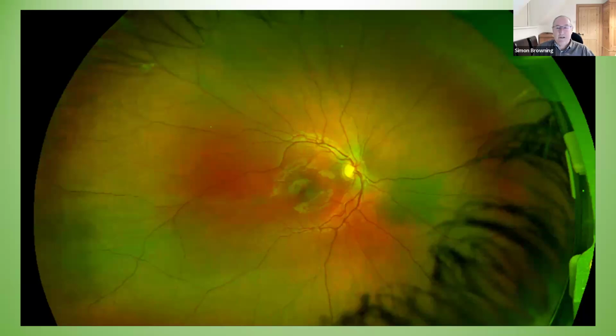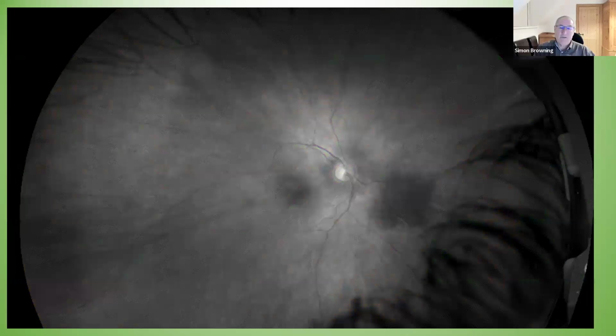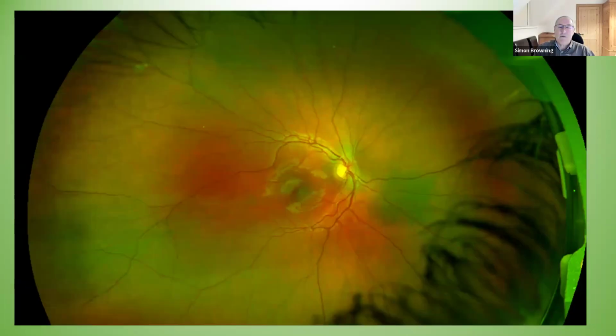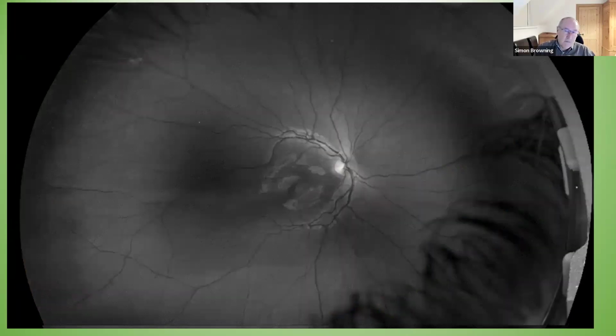So come back to one of my favorite images here. We see a classic. This is probably here, although it's in a very young child. It is a reasonably large lesion there. But characteristically, these lesions, you will see the pigmentation, you will see it at the choroid level, but you will not see it on the retinal level. And again, this is where depth can tell you much in the lesion. So whenever you see a lesion pigment, look at the different layers to see where it's occurring.